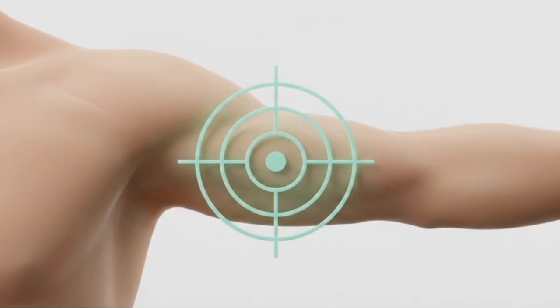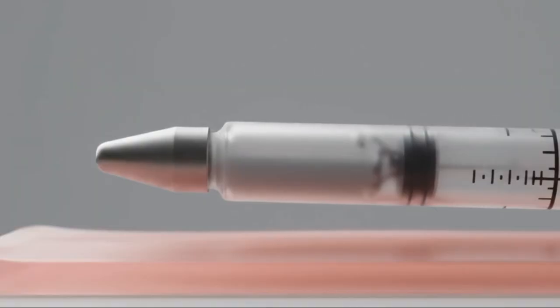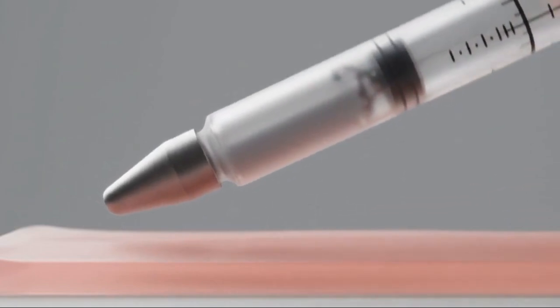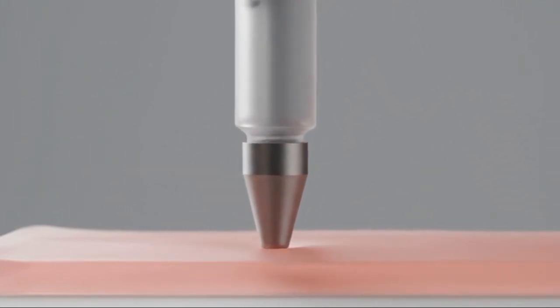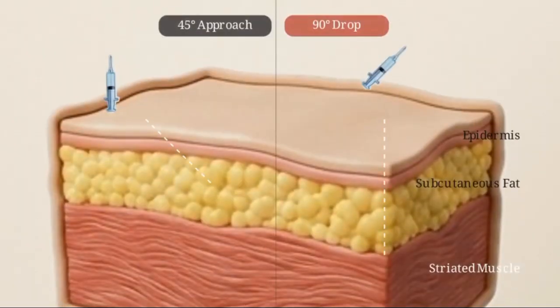Step 1 is knowing exactly where to strike. Step 2 brings the focus out of the anatomical map and onto the physical syringe in your hand. This specific video demonstrates the final, absolute mandate of the modern intramuscular protocol, establishing an exact, rigid 90-degree alignment before you strike. This cross-section compares the strict 90-degree drop against a slanted 45-degree subcutaneous approach.